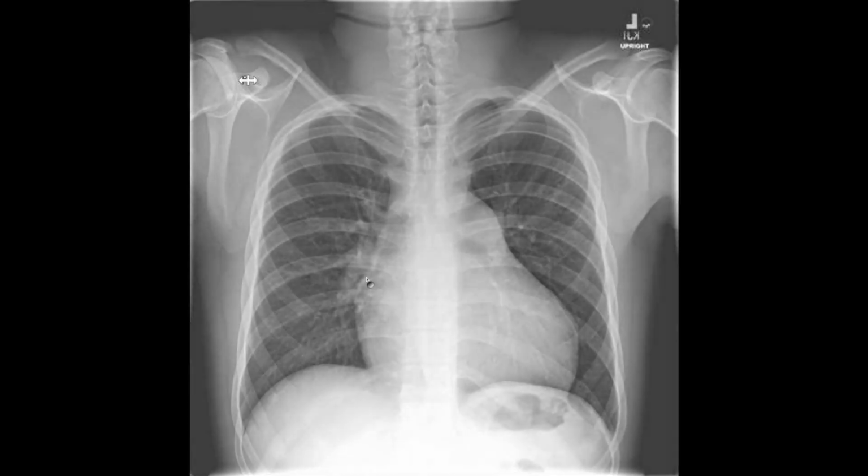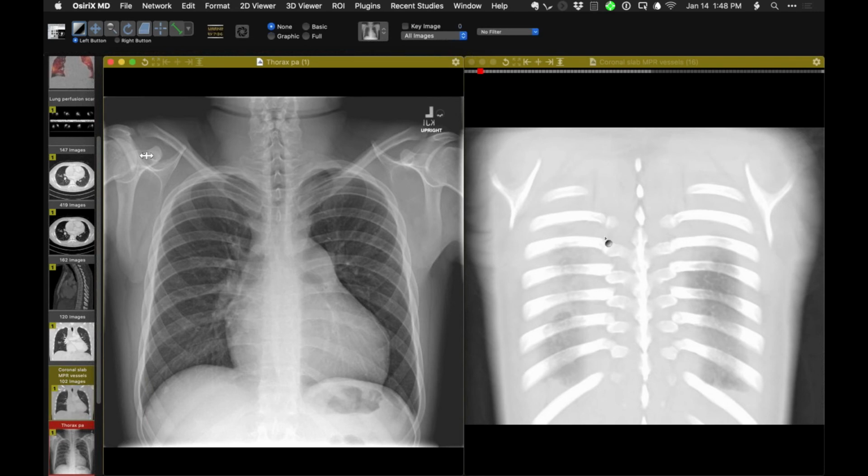And then in analyzing the pulmonary vessels, and this is subtle here, so I am going to put alongside some images from the recon from the CT. But let me try and fix that, what happened there. So let me go back to default. And that. Okay, so let me just make this big for a second.